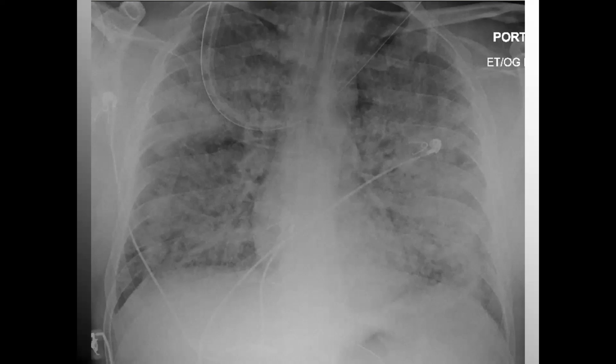As far as bones, they're not easily seen, but I don't see any obvious fractures, breaks, fissures. Ribs look good. Cardiac, I can see my right anterior border, but I can't so much see my left. It is silhouetted with all of these infiltrates. I mean, there's infiltrates bilaterally. This is what we call fluffy or puffy infiltrates bilaterally, but we're not done with the ABCs.